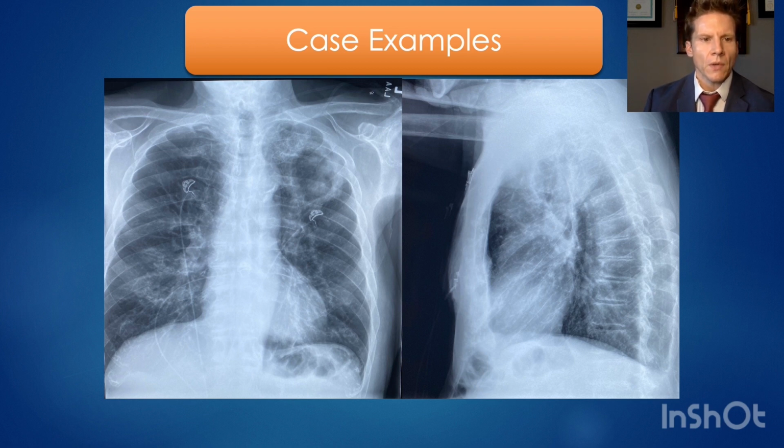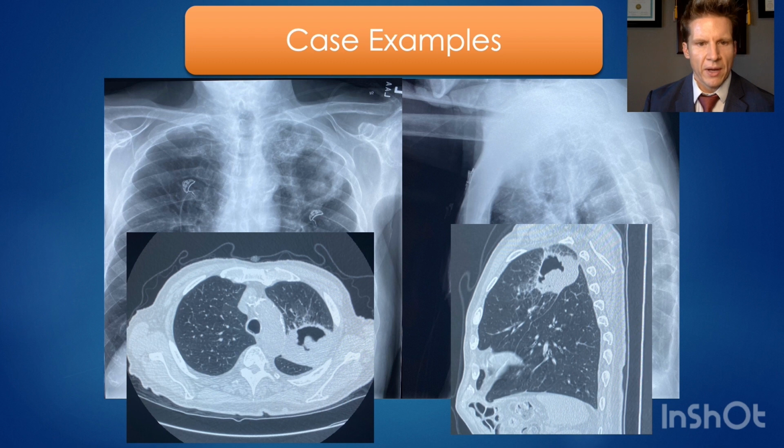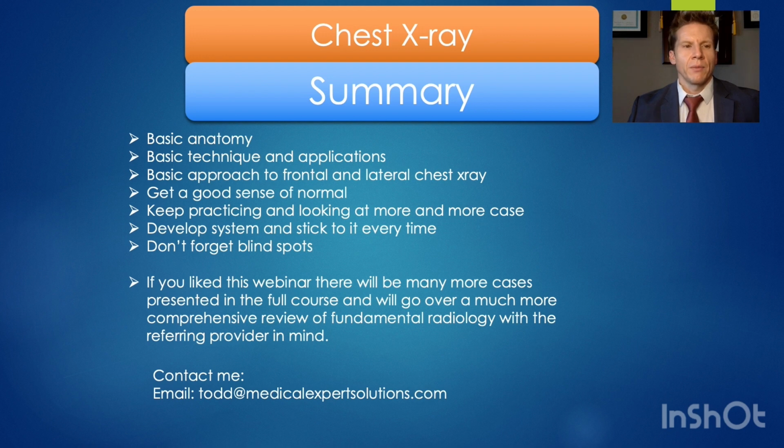malignancy? So here, again, we know that we have this abnormality and we get a CT, and this is the corresponding abnormality on the CT. Again, we see this cavitary mass with some big irregular soft tissue density along the dependent margins of it, and this ended up being a necrotic lung cancer. Okay, that's it for now.